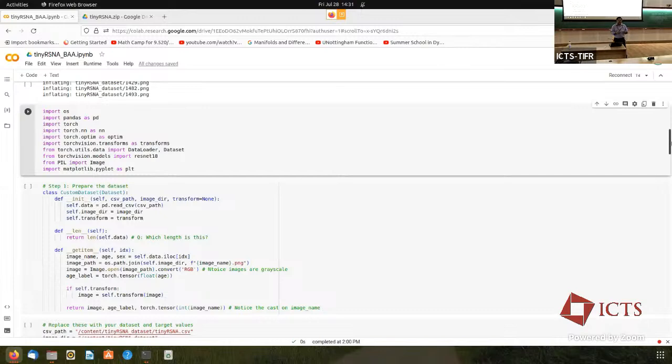It's always a good idea to try things out first. If you're working with 10 GBs and something goes wrong, you don't know what is going on. Try it with 5. What's wrong with 5 images? The code will still run. You should always try things out with fewer images so that you know exactly what you're doing. Everything is faster with 5 images: you'll debug faster and run code faster. And then what's the difference between 5 and 5,000? Nothing. Once your code is right and sanitary, it will work for 5,000.